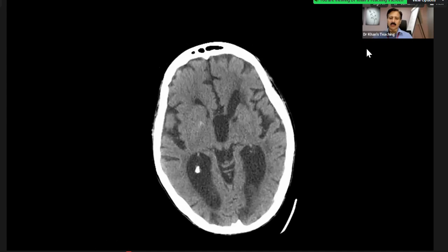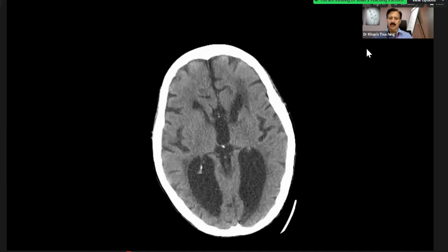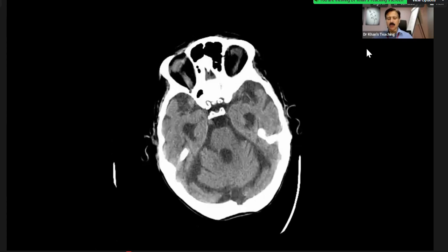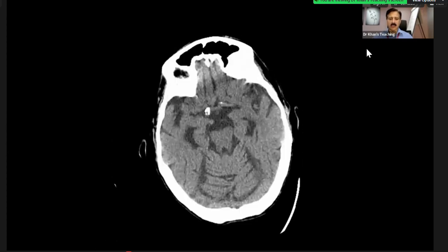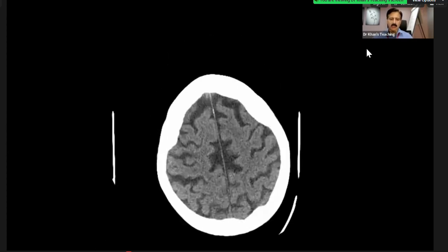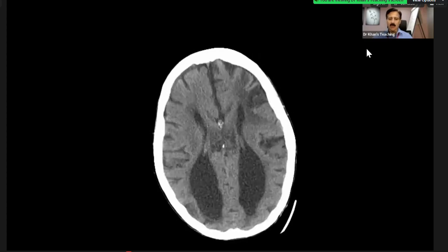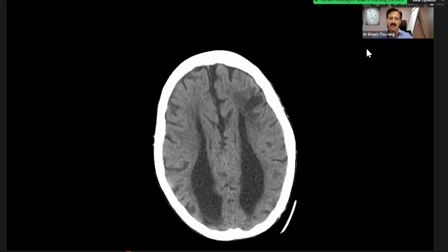Because this is a 73-year-old with a corpus callosum agenesis, complete agenesis. And the point is that I will open an axial slice and you will go up and down and say that there is atrophy, this is small vessel ischemia, and so on. But actually what is happening? Look at the ventricles and the space, they are widely spaced. They are parallel. That's the key.